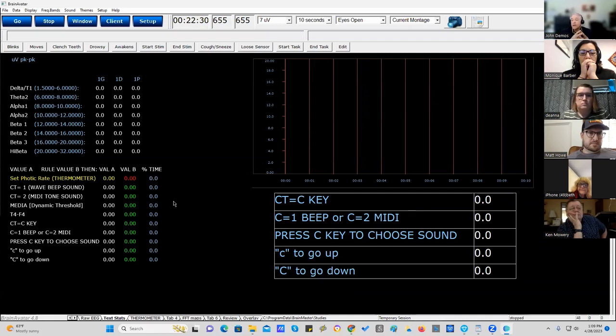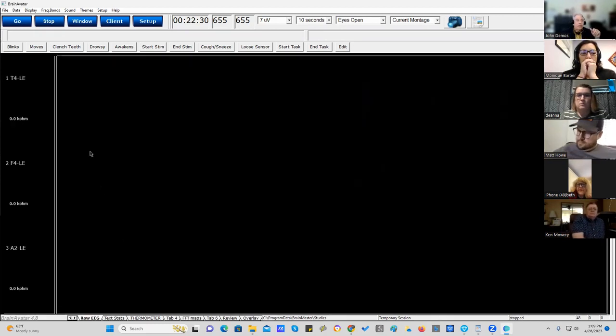Typically, when we train for anxiety disorders, we often resort to bipolar montages. And notice that the bipolar montage pivots off of T4. Inside T3 and T4, inside the temporal lobes, just beneath them, it houses the amygdala. That's why we're pivoting off of T4, because there's where the amygdala is.